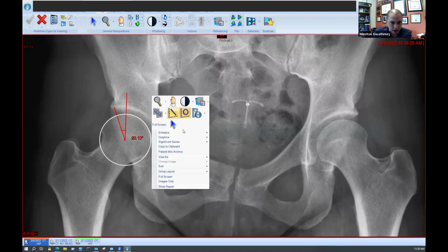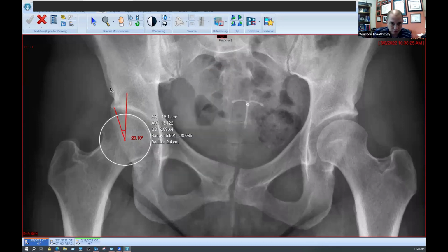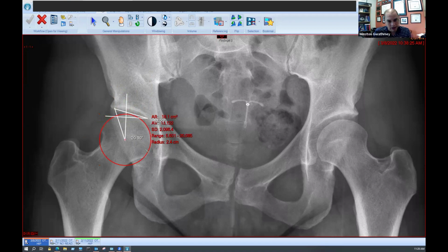And then we're going to draw that second line here with that Tönnis angle. Again, we're going to do a parallel line and do that right there. Tönnis angle, put this in the medial sourcil and put up like this and get a sense of what this is. And you can kind of get a sense of, now we're looking at, you have this guy a little more dysplasia.